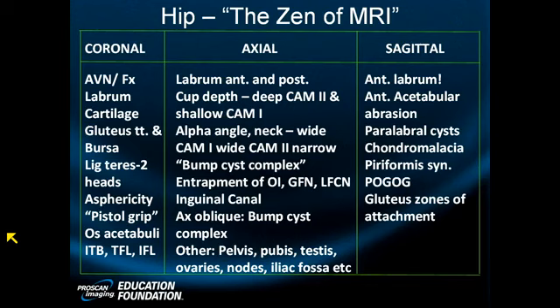I like to look at the fit of the head in the cup. You know, is it the right fit? Is it conformed? Too deep? Too shallow? I also get a pretty good feel for how the ligamentum teres compare to one another. Now I would say that both acetabuli are a little deficient. They don't go out quite far enough. So most likely this young person has a mild forme fruste of developmental dysplasia of the hip. This is one form of developmental dysplasia, under coverage.